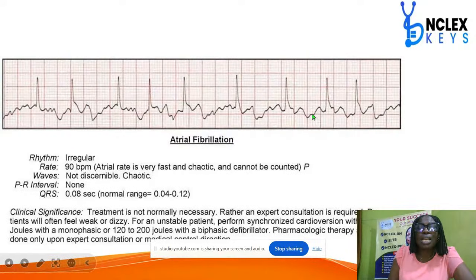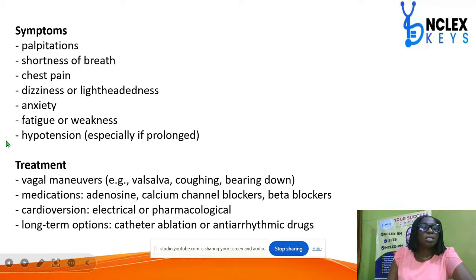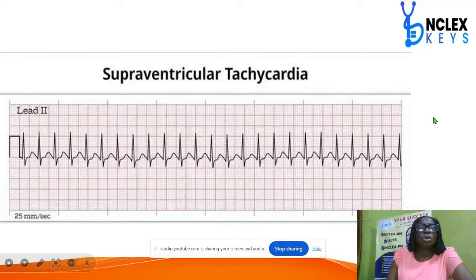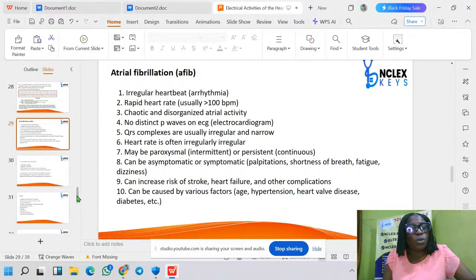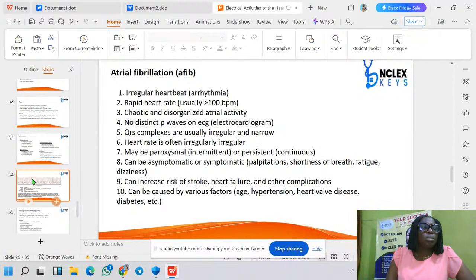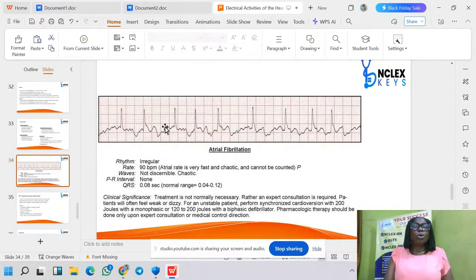But you can have something like this too, bringing confusion between what we know as AFib and A flutter. Do you understand? But when you have such a confusion, maybe you are finding it difficult to distinguish between sawtooth and the other presentation, just look at this R to R.